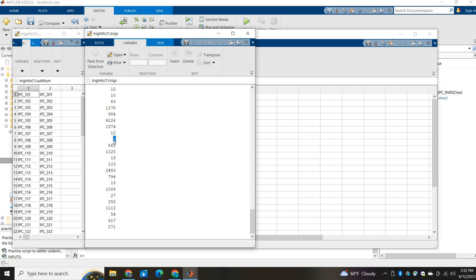You'll notice some people don't though. So some of it's like 0. So that might be problematic for me. Or possibly they just started it right as they were leaving. This is something you're going to have to know. But I'm pretty happy with this. I know that actually for those, they did just start it right as they were leaving. They forgot to put the trigger in. So I'm like, oh great. For this conversation, I don't need to change anything.